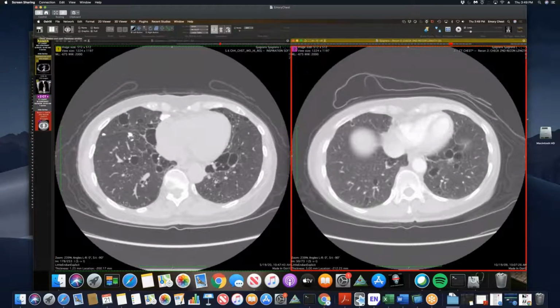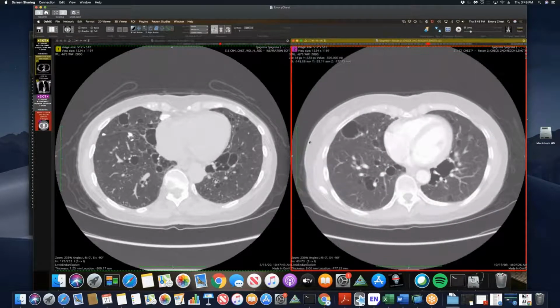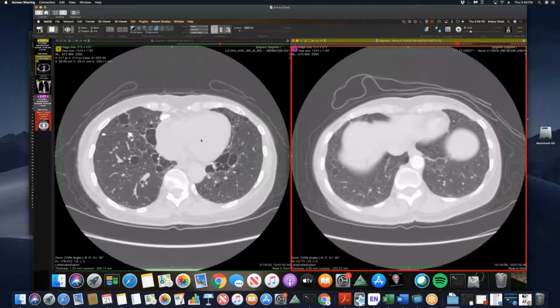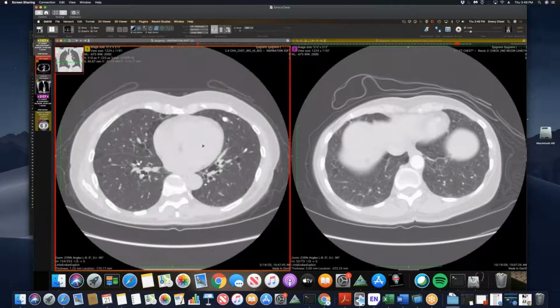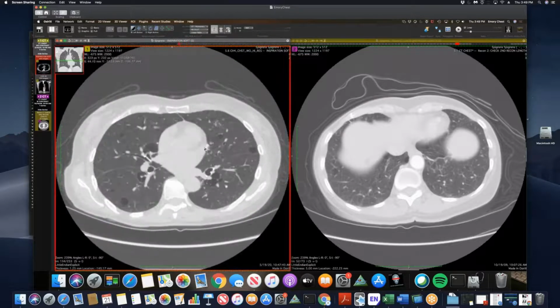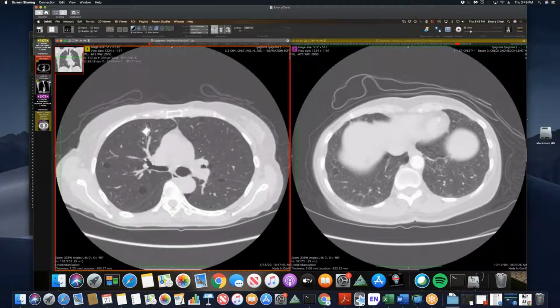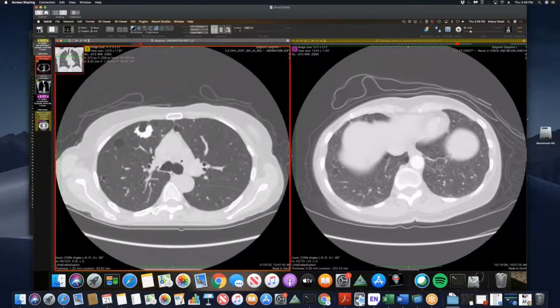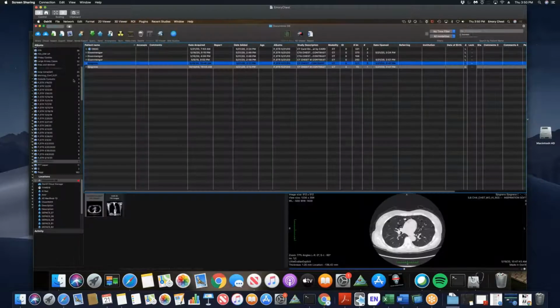Yeah, it's a very nice demonstration of the amyloid in the sense that we have all the nodules with calcifications or ossifications, and many of them are, not surprisingly, in proximity to the cystic areas. So it's the protein that produces the cysts. Interestingly, she did have a transbronchial biopsy a few days ago, and they weren't able to demonstrate any amyloid on the Congo red, but it might have just been a sampling error. They just saw some interstitial lymphocytic cells.